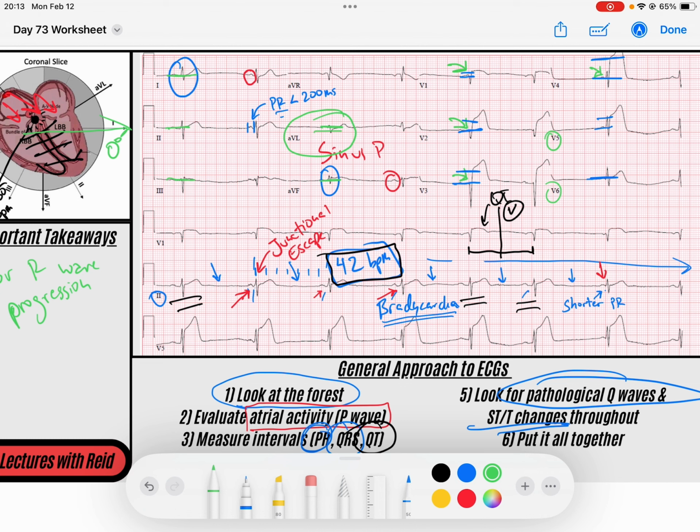And so let's talk about what's the distribution of this infarction. Well, the most predominant leads are probably V5, V4, V3. And we know that, with V4 being the center of gravity of this ST segment elevation, these are the anterior leads. And we said we've got some septal involvement, V1 and V2, which are our septal leads.